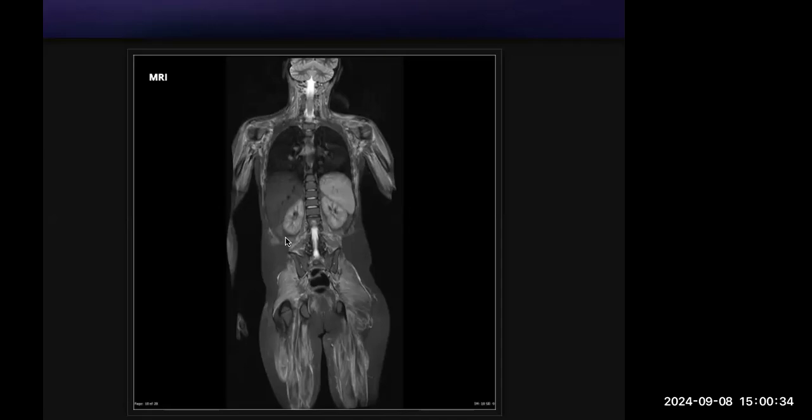Proximal esophagus. Correct. Why do you think so? Because it could be skeletal muscles more. Yeah, correct. Dermatomyositis involves the striated muscles, so it's always involving the pharynx and the upper esophagus. On the other hand, reflux disease is associated with the lower esophagus. So always remember, that's a very striking thing that you should be noticing. The lower esophagus will be completely normal in such cases, but the upper esophagus is where you should be targeting, right? So that was a case of dermatomyositis.